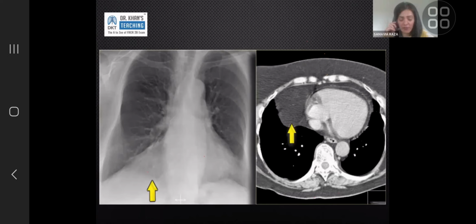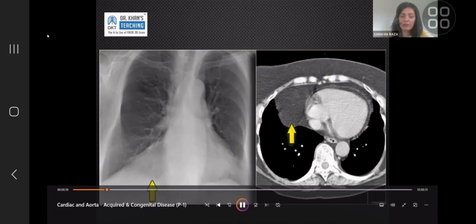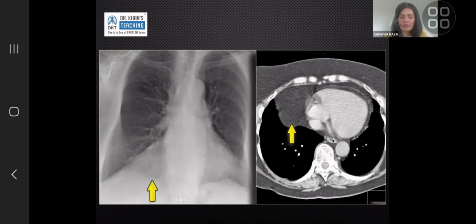Of course, on CT or MR, you're able to be more confident because you can see that that density is pure fat. When it's quite prominent, it's really worth excluding that you're not missing a hernia. So it could be a congenital hernia that contains fat. That would be more lobulated. That would be quite prominent. But in most people, especially elderly or obese patients, the mediastinal fat can be quite pronounced and shouldn't be misinterpreted as pathology.